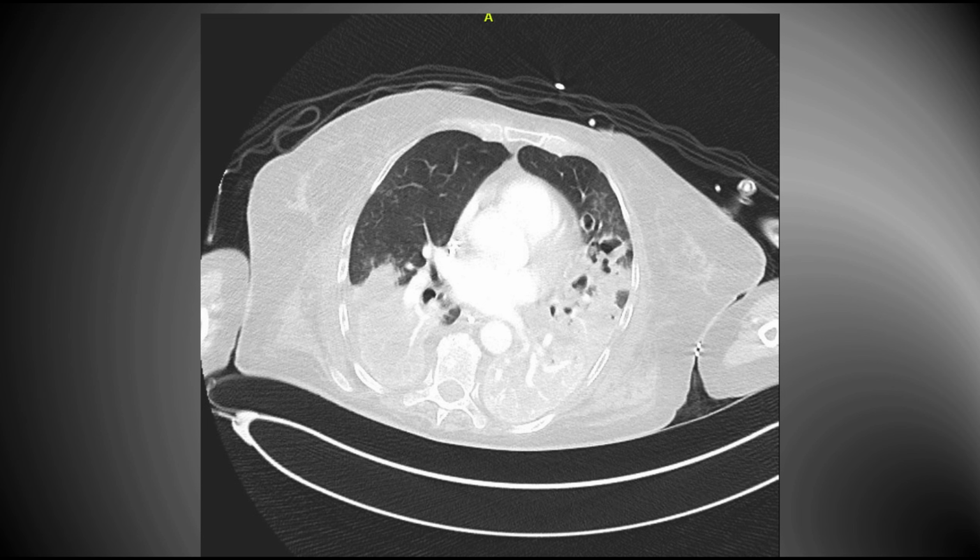Now, a question you might be asking at this stage is, what about John? Do you remember John a few minutes ago who had community-acquired pneumonia? And I described pretty similar findings. And I said, well, this is bronchopneumonia. Why is it not ARDS? But of course, it can be ARDS because most of the patients we see with acute respiratory distress syndrome these days have it as a result of community-acquired pneumonia.